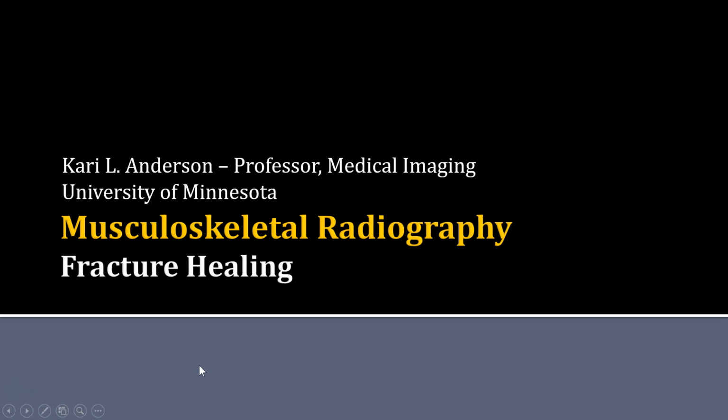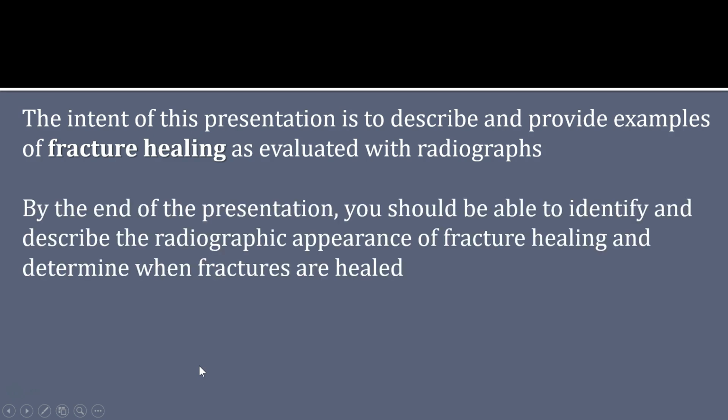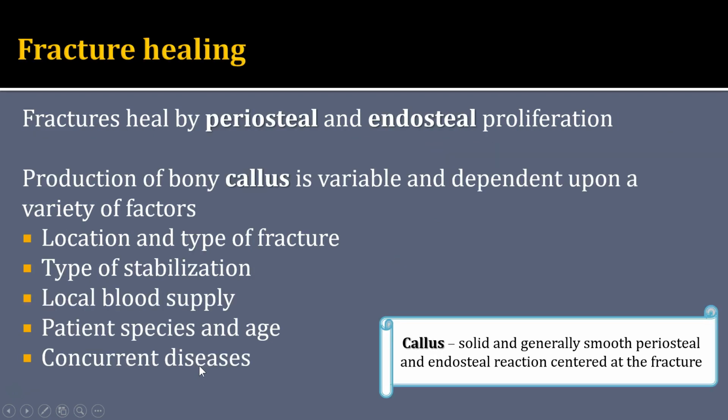This is the third in the series of presentations on the topic of radiography of musculoskeletal trauma and repair. In this presentation, I will describe and provide examples of fracture healing as evaluated with radiographs. And by the end of the presentation, you should be able to identify and describe the radiographic appearance of that healing and be able to determine when fractures are healed.